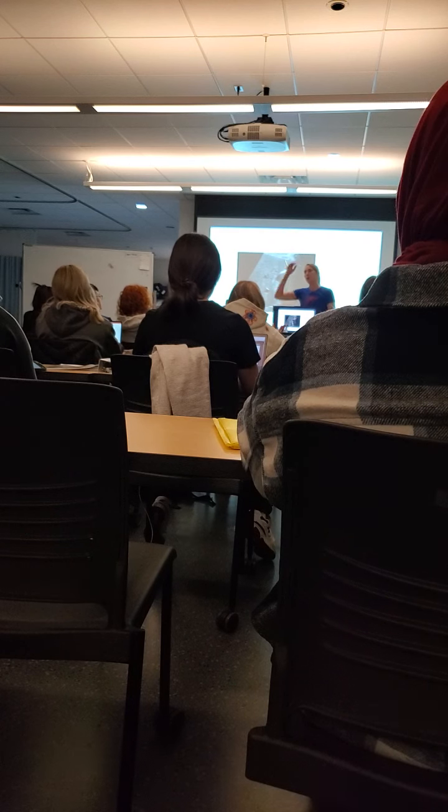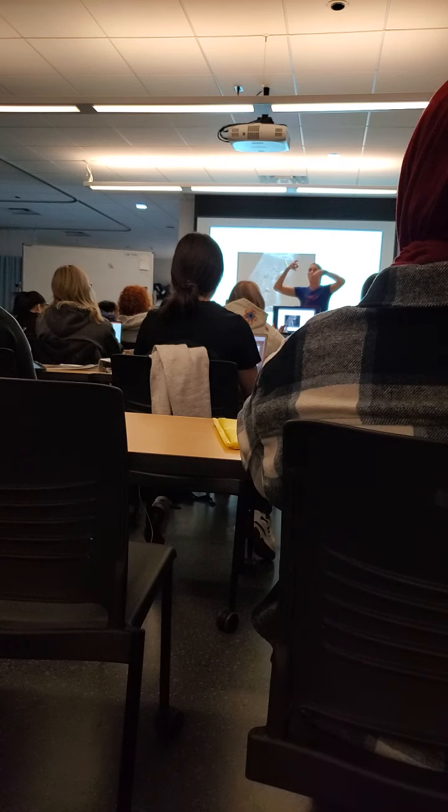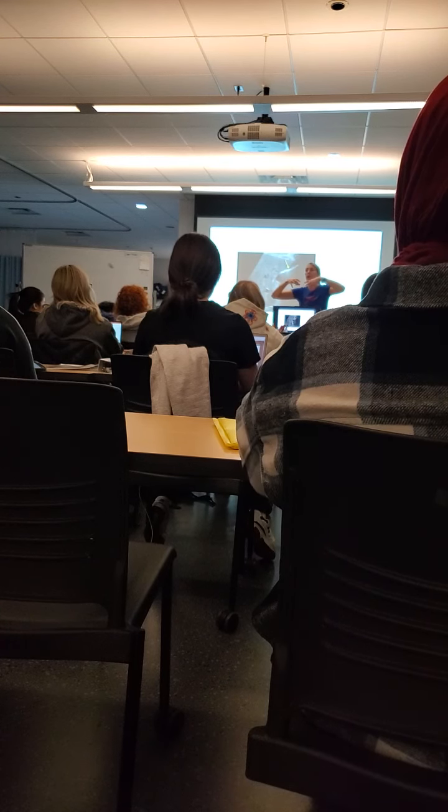So the stone shadows can be very, very dark. Our beam is not able to penetrate through. It's just all reflecting back. Whereas gas shadow diffuses our beam. And so we have a little bit of beam returning, so it's more like a dark gray versus an absolute black. This is gas shadow.